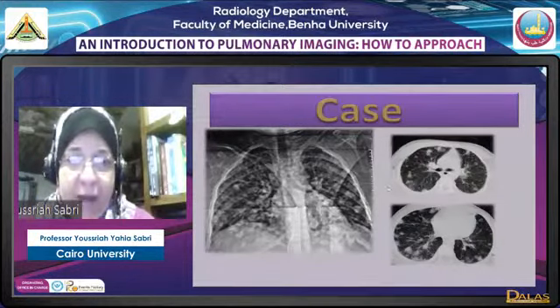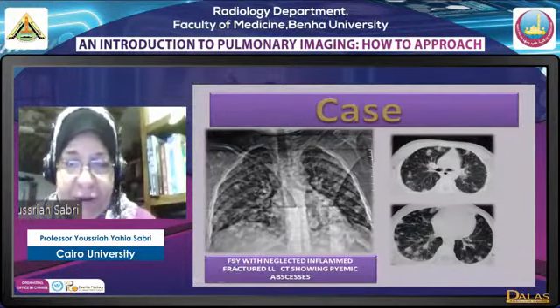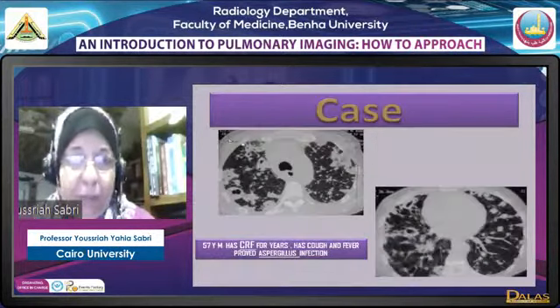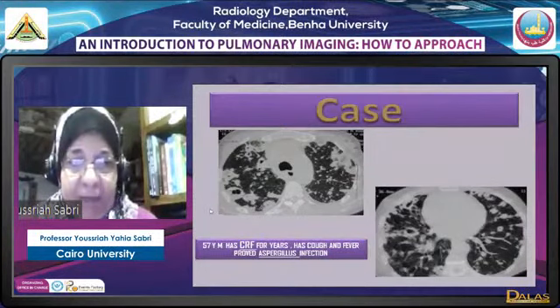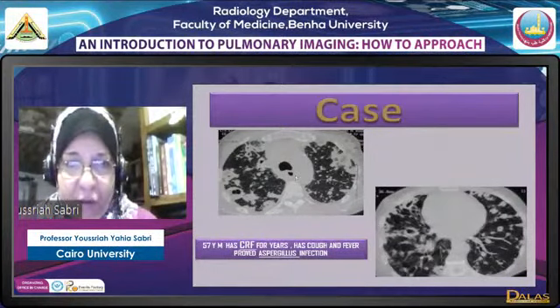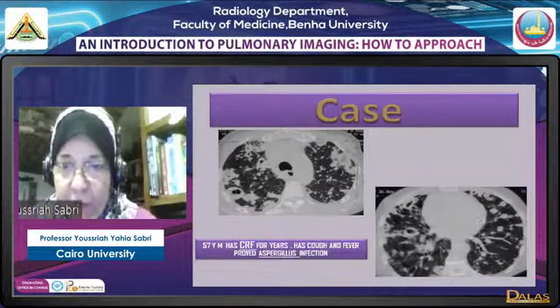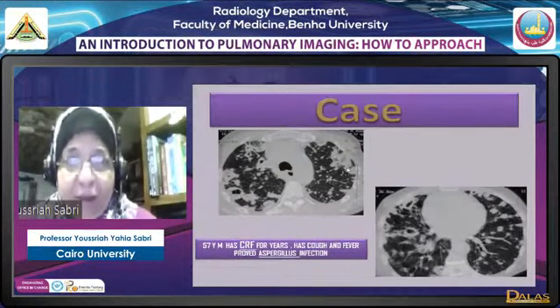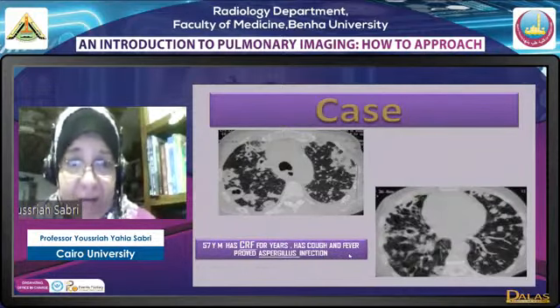Actually, we had the history: a 9-year-old female with a neglected inflamed fracture, and these are pyemic abscesses. In this case, this was a male patient with chronic renal failure, and we find bilateral multiple nodular opacities, as you can see, with cavitation. Some of them are rather bizarre in appearance. We considered infection, or atypical infection, and it was a proved case of Aspergillus fumigatus infection.